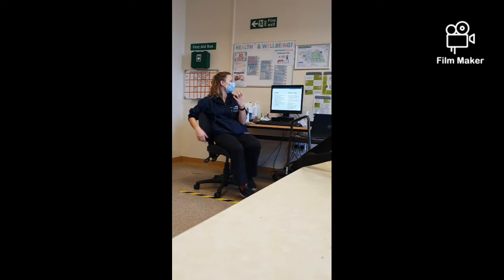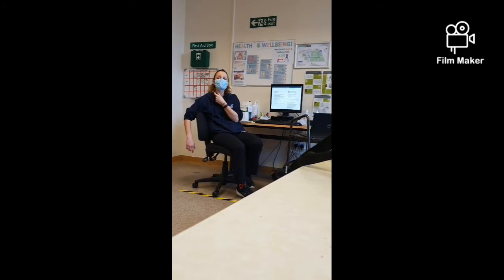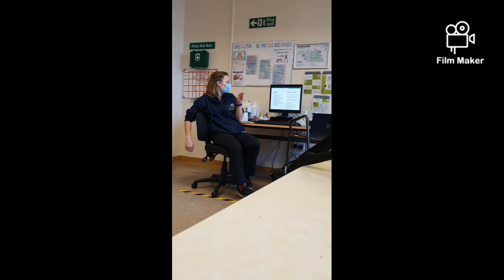Okay. So airway. So your trachea. We're looking at, is it central? Is it central on the chest X-ray, or is it deviated to one side or another? Okay. And just to note that actually it does deviate slightly as it passes the aortic arch. So is it deviated because of the aortic arch, or is it deviated because there's something like a pneumothorax or atelectasis, a bit of lung collapse? You should be able to see where the main bronchi are and how they separate, and the carina.